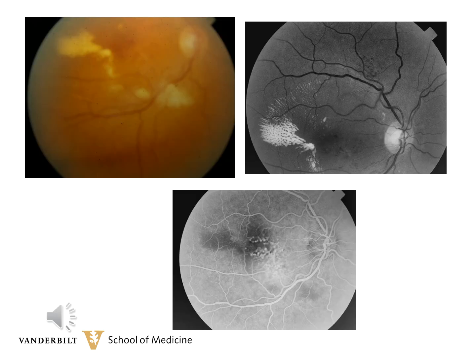This patient has severe hypertension with prominent hard exudates from her microvascular angiopathy. Some of her microangiopathy shows hyperfluorescence on the fluorescein angiogram. The exudates, some are mid-retina and some are deep, and on the fluorescein angiogram do block the choroidal fluorescence.